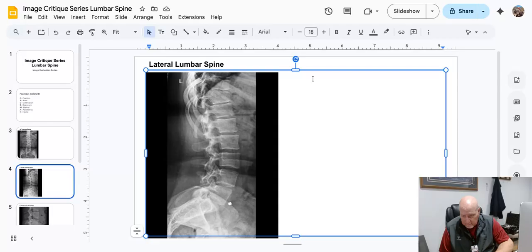We do have a marker. This is the left lateral, which is what we shoot. So it's marked correctly. So aesthetics, it's a pretty good image. It's a nice picture of a lumbar lateral. Like I said before, maybe there's a little bit of motion up here. You see a little bit of blurriness up in here, but not so much down here.